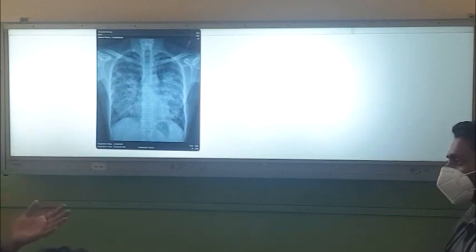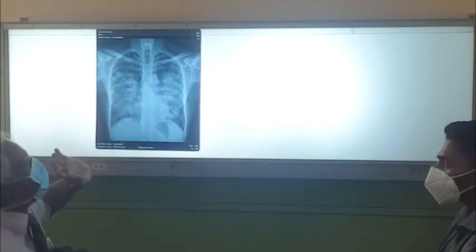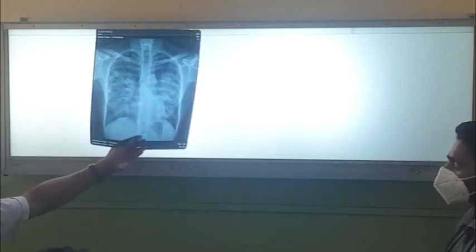You have to examine and see. So there are a lot of lymph nodes, FNAC showing adenocarcinoma. So it's a lymphangitis carcinomatosis, right? But you have to think of pulmonary edema, atypical infection, everything, right?